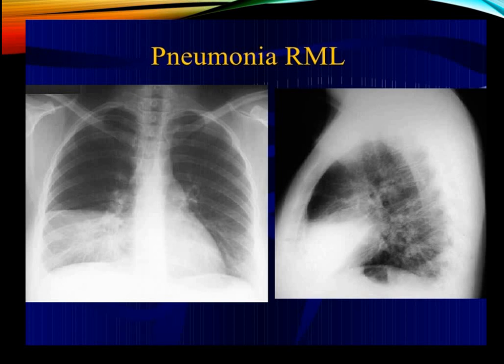So we have patchy opacifications, and this patchy opacification is not associated with any loss of volume, as you can see the mediastinum is central, because a patchy opacification in this location would usually cause mediastinal shift or elevation of the diaphragm. Neither of them is present, which means the patchy opacification is not associated with loss of volume. So we are dealing with consolidation.